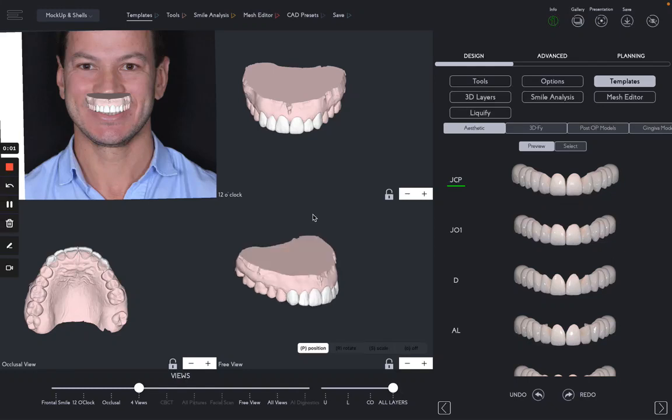Hi, in this video I will show you how to check the thickness of your 3D design. If you've never done a 3D design, I recommend you watch our 3D Smile Design tutorial videos or come into our live trainings that happen weekly for our SmileFy members.